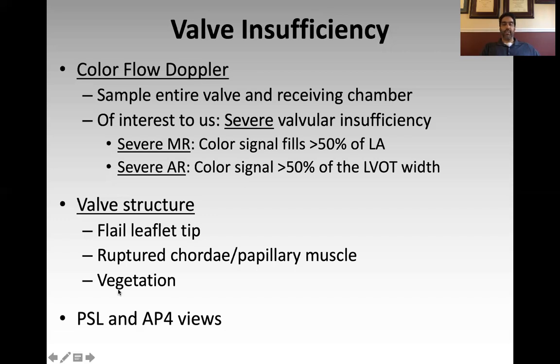The next thing you look at is valvular insufficiency. And so our job as intensivists is to identify evidence of severe valve insufficiency, because it's severe valve insufficiency that's going to contribute significantly to your shock state or cause your shock state. Okay, I will preface this by saying that the assessment for valvular insufficiency, valvular regurgitation, is a complex one. It takes several steps, applying various color and quantitative Doppler techniques and various measurements and things like that. So it is a very involved process.